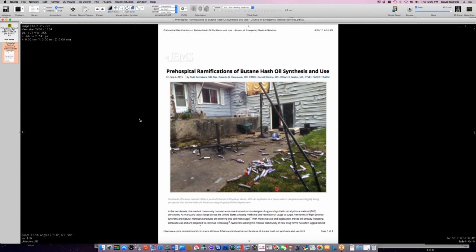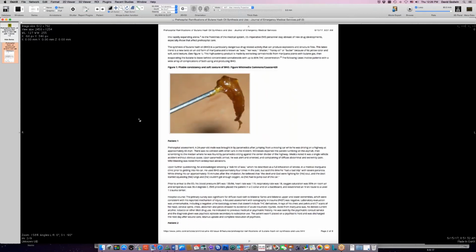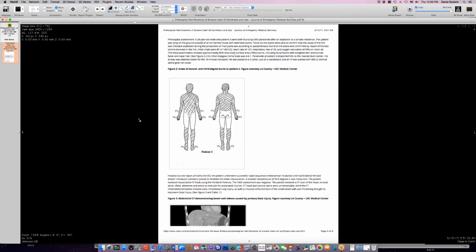Right. We had a case like this about 6 years ago, and there was a biopsy in that case, and it had a bronchiolitis that looked just like this, and they diagnosed AFOP, so acute fibrinous organizing pneumonia. So it's an organizing pneumonia with a necrotic component to it, and it was all in the airways. And so this looks a lot like that case. That was a 19-year-old, and people didn't quiz him about his drug abuse, and he had a lot of complications from that. He did not do well. So yes, I like the idea of an organizing pneumonia, an AFOP organizing pneumonia that is part of this bronchiolitis.